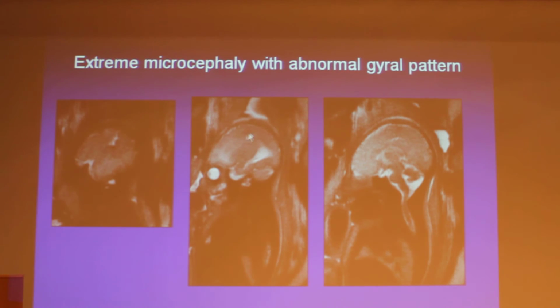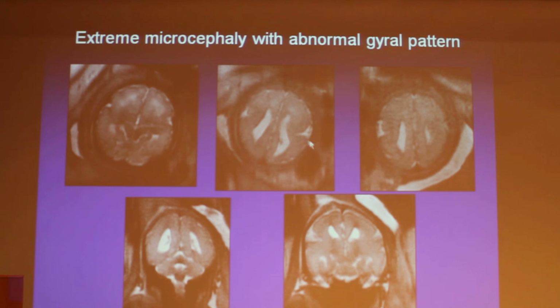We noticed that the forehead of this fetus on ultrasound was flat, and they couldn't quite see the gyration on it, and it was not as easy to see it here. We thought maybe it was a problem with the skull base, but if you look closely, you can see that there is a beginning of a figure of 8 abnormality. You see here that the gyri are abnormal. Look at the frontal horns on the coronal imaging, which are very important, prenatal and postnatal. They usually have a lot of relation to abnormal development, and you can see how abnormal the cortex is and the way the frontal horns kind of stand up.